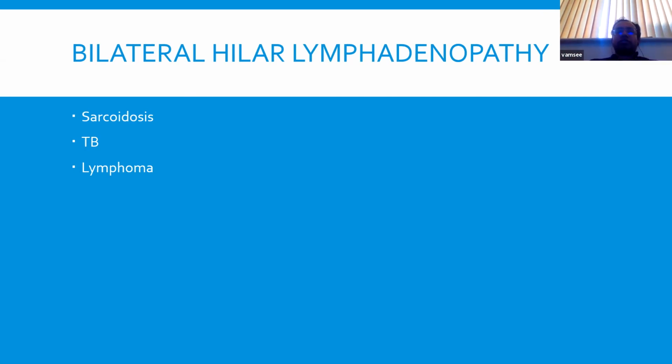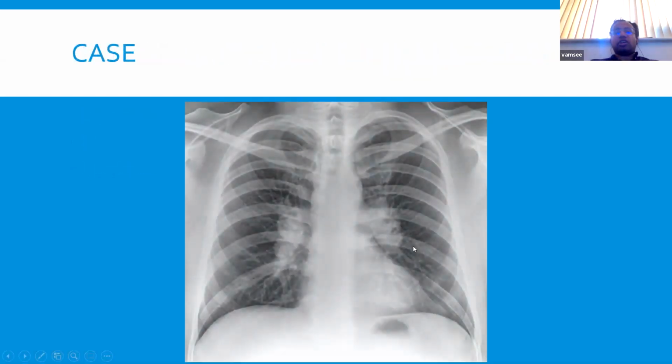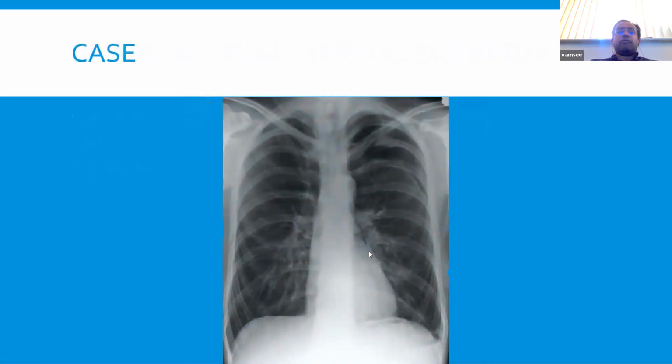But what I wanted to just get you across is usually when it's present, it's usually not subtle. It's usually quite prominent, at least as far as exams go. They tend to go for the more meaty examples. So just commit that to memory. That's roughly that kind of appearance where you can clearly see a massive increase in size. Fine. Okay, all of you, just have a go at this. Tell me what you think. I hope it's projecting clear enough to pick up the pathology, and we will discuss it in a few seconds.